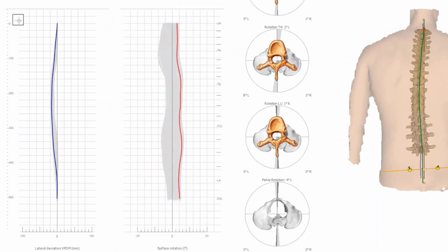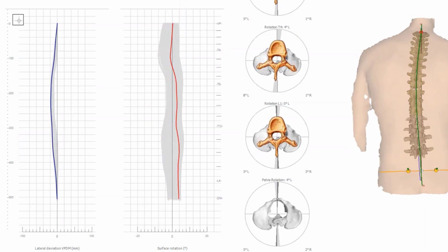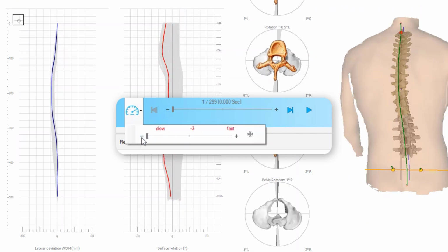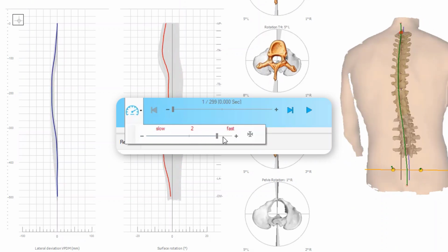A tip. In DIERS 3 versions from version 3.14 onwards, the playback speed can also be varied via the video control. In some cases, the described sequence can be better derived in a slower display. This function is available in all dynamic examination types.